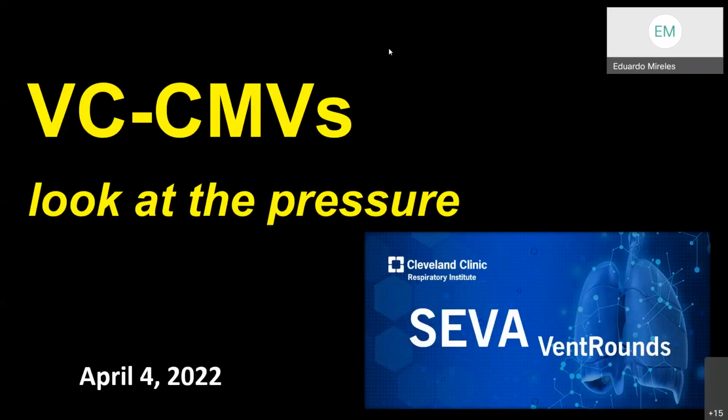I placed a couple of waveforms today, thinking about volume control, continuous mandatory ventilation with set point targeting. And today, I think the message is look at the pressure. There are several examples for us to go through. We start with some basic, and then we start going into a little bit more esoteric cases. So let's get started.